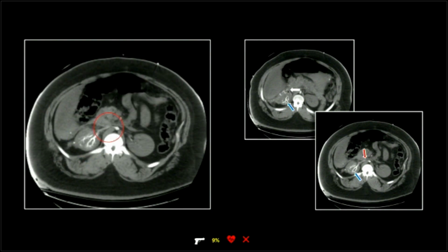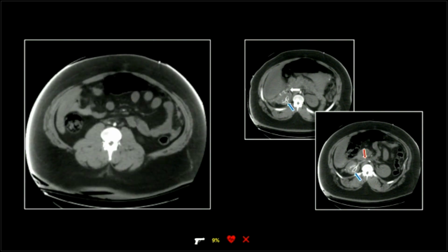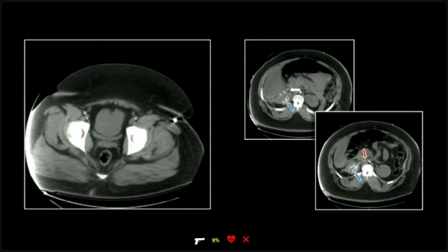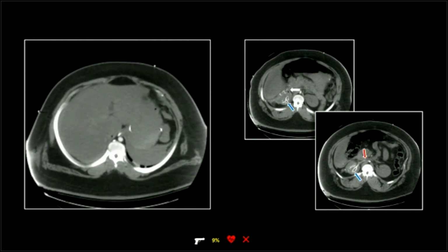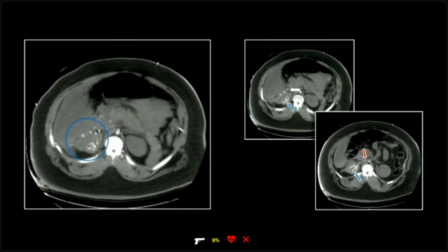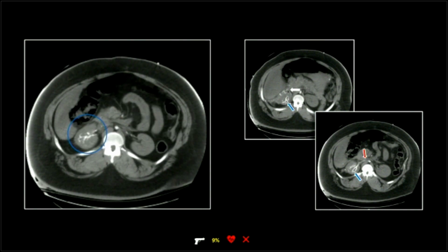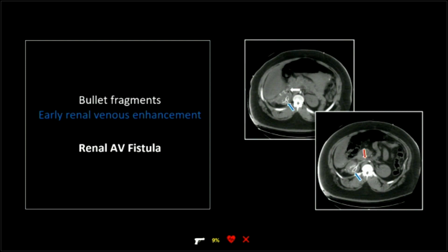And that's what separates this case from the previous right renal artery avulsion with retrograde contrast, right? The appearance of the right kidney is very similar in both of these, right? But this one's an AVF. That's incredible how tiny those vessels are, and you actually kind of have to intuit that communication there.